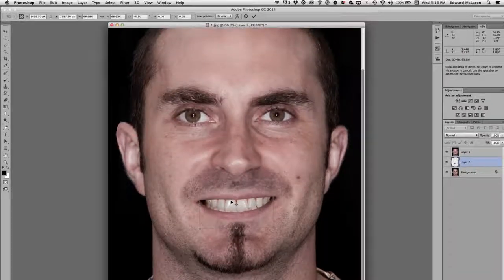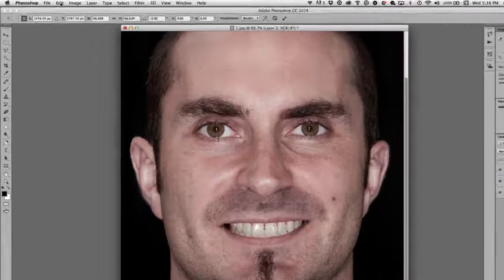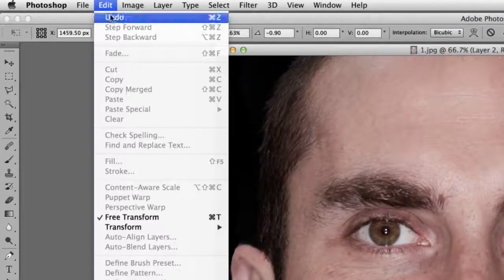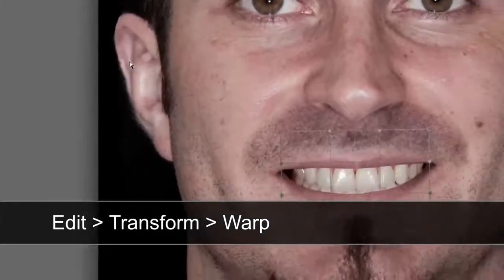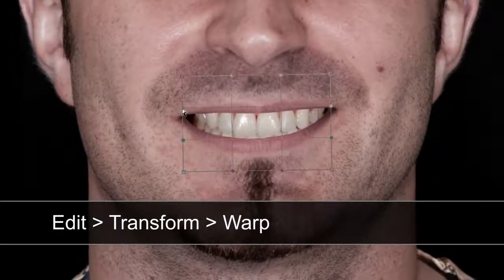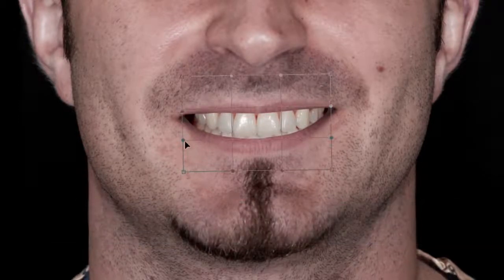Now you can see we have a little plane of occlusion issue over here. So his issue, it may be a little rotation issue here. So there's a really cool tool that's only in Photoshop. Okay, so we're going to go over to the Edit menu, Edit, Transform, Warp. And while this is active, this Warp tool comes up. And now what I can do is selectively warp and grab this little circle here in this box. And it's now just slightly changing this area right here, okay?